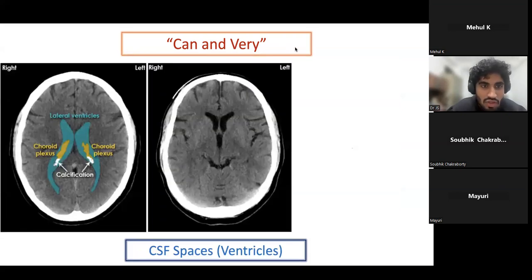Okay, so this is a lateral ventricle, with CSF. Our brain is how much? It is around 1.5 kg, and it is floating in the CSF. We are not feeling our head weight because it is floating in the CSF. There is almost a 90% decrease in the effective weight, so it comes down to about 150 grams. So in CSF it is almost floating.